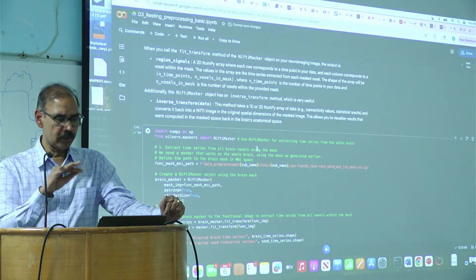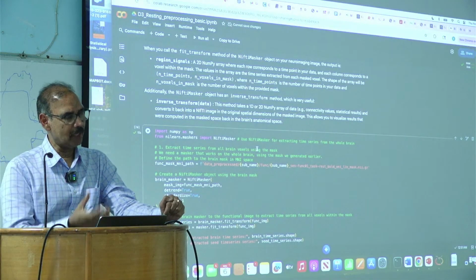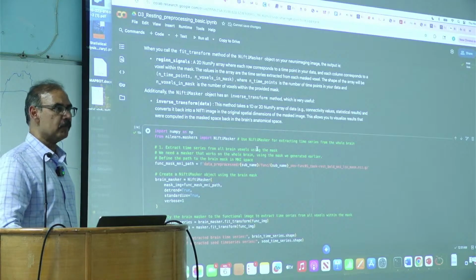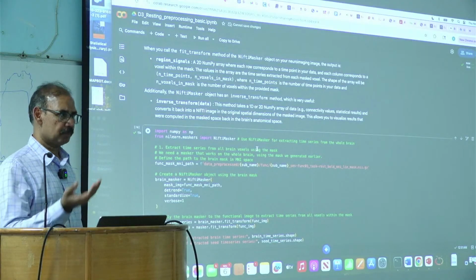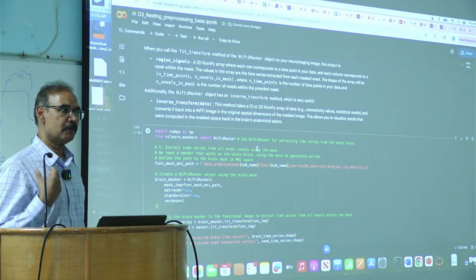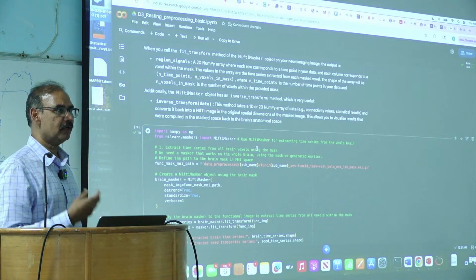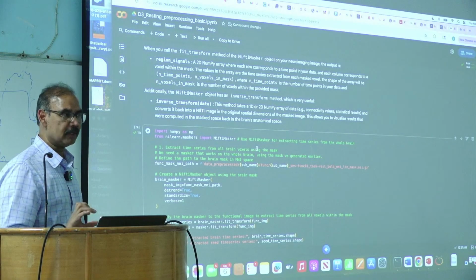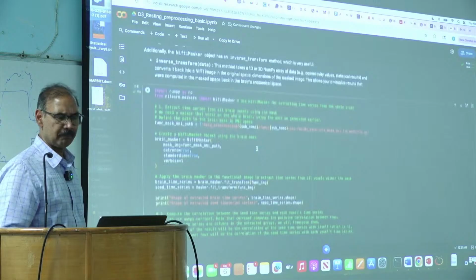Again, all the commands are here, but you have to decide which steps to take. For the data, you have to decide what z value to use. Should you use a spherical radius? If you use a spherical radius, should it be 6, 8, or 4? Those are the questions that you have to decide. If you have questions, we can play around with that and see. Anyway, I'm here.